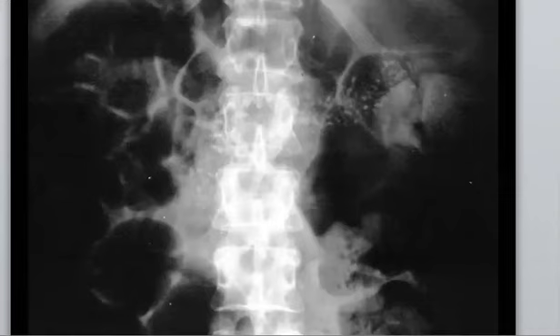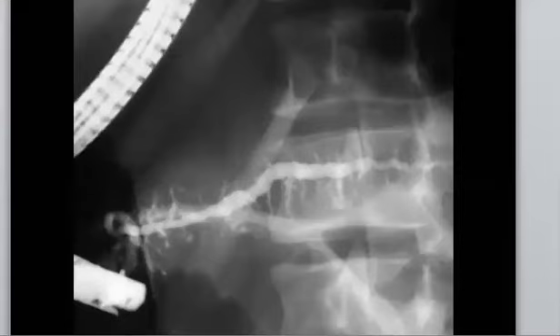What are your keywords? Let's try to train for the exam keywords. Calcification, yes. So calcification, you can see here clearly. So in the checklist of the X-ray of the abdomen, you'll find the calcifications.